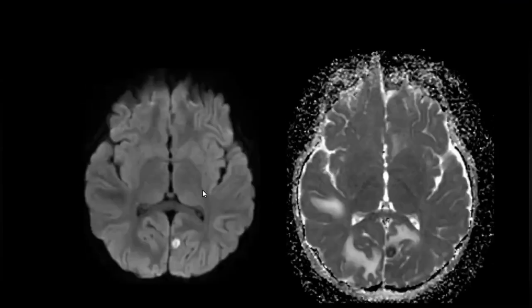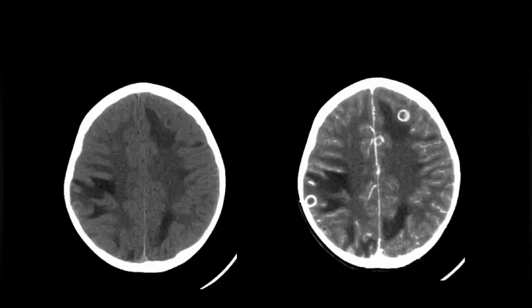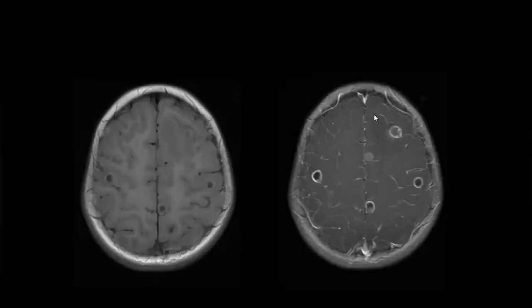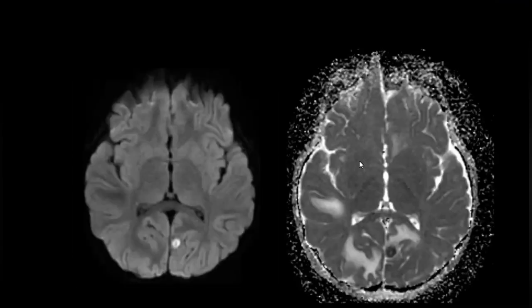And now I will highlight some of the points. In this lesion, if we just have to imagine, there is an eccentric area of enhancement. Okay. Another feature of these lesions is that they are at different stages. This is bright on FLAIR on the T2, no edema. This is not that bright and has edema. Okay. This one is enhancing. There is an eccentric nodule enhancing. This has a different signal as compared to the other one. This lesion has a different signal. And similarly on the diffusion, they have a different signal.